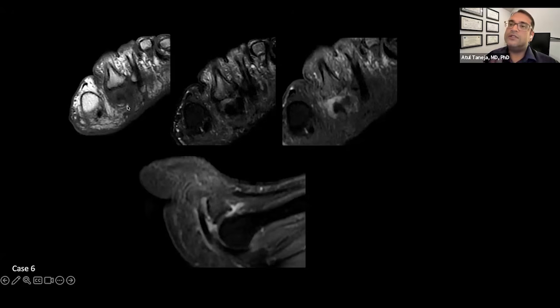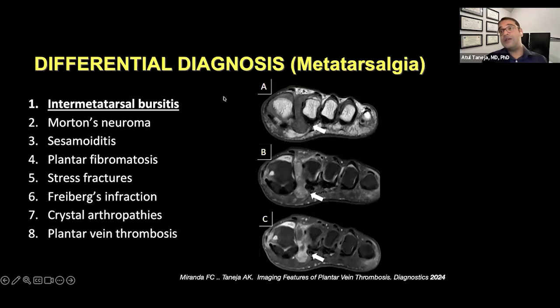As you can see, on this short axis, you can already tell the proximal phalanx is extended. The MTP is way extended. So you can tell these hammer-toe deformities on the MRI. Now let's move to our last part of the lecture today. I want you to remember another differential diagnosis for forefoot and plantar foot pain.